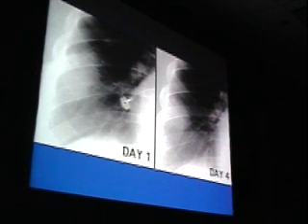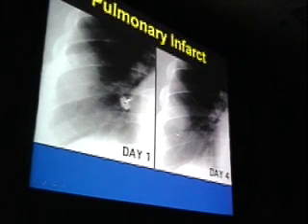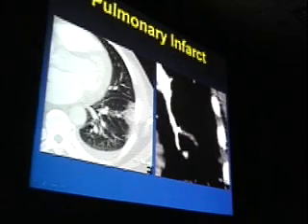Now, most pneumonias, as they are treated, become less well defined. Infarcts become more well defined, just like an ice cube as it melts, retains that shape, and its margins become more well defined, as you see here. It's another infarct on CT, a peripheral area of consolidation, ground glass opacity. Sagittal reformat shows the clot within the subsegmental artery.